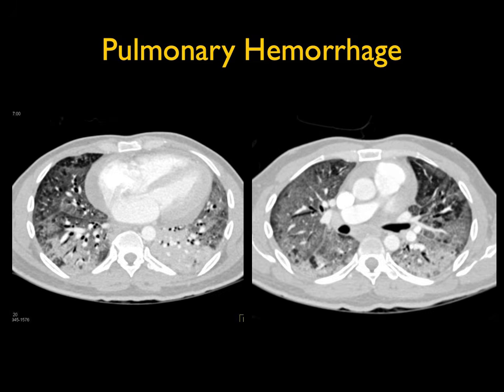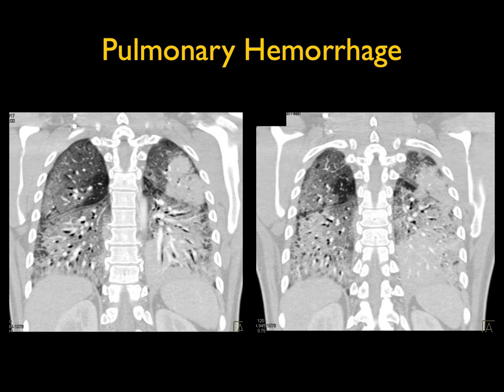In this case, ground glass opacities bilaterally. It's increased toward the bases, but you can see on the coronal view it's diffusely involved. Yes, the first thing you think about is infection. We always think about infection, but with the density and distribution, you're not really thinking about edema.